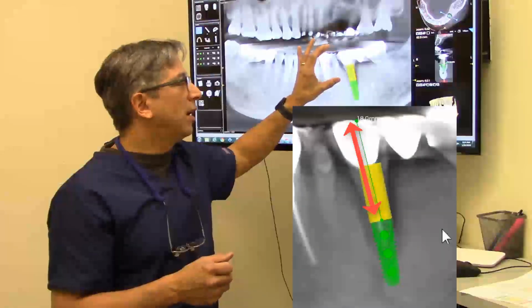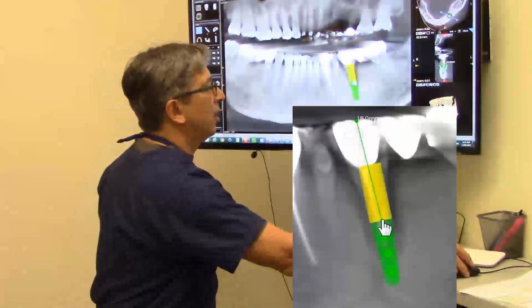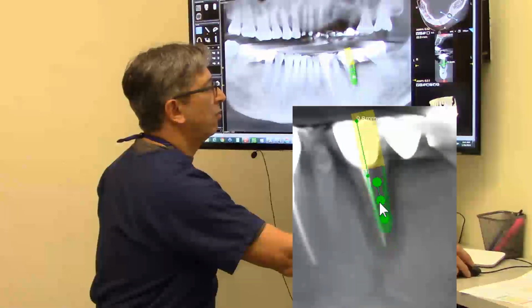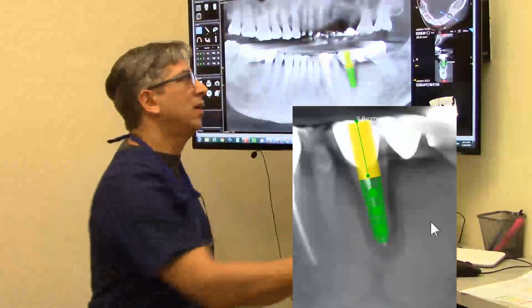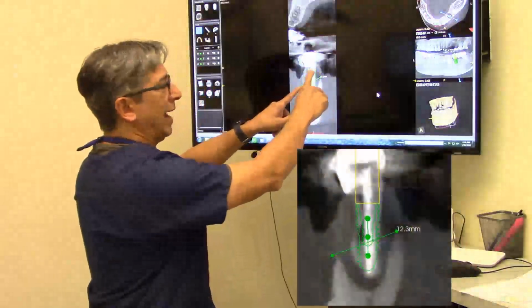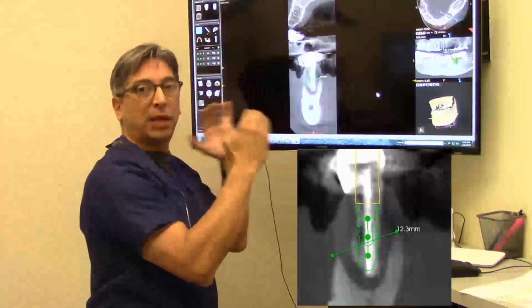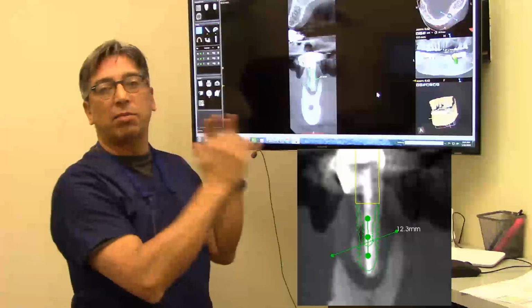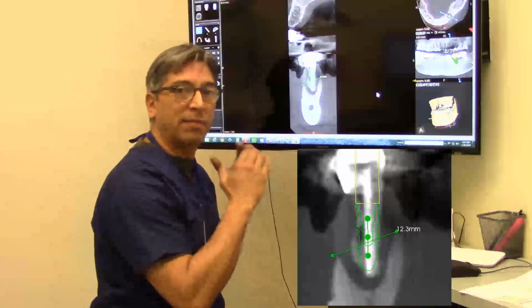But the other thing is, once you have that graft in there, and let's say you solve that problem, and your implant now can come up to where you would want it, more like you would predict if you only had a panoramic X-ray. But that really requires that you maintain quite a bit of bone. Over half the implant has to get into this new bone that you've helped create with your specialty graft material. So this is not a trivial thing at all. I wouldn't do that. I'd probably refer this one to a periodontist that really understands grafts and structures and membranes to do this one.